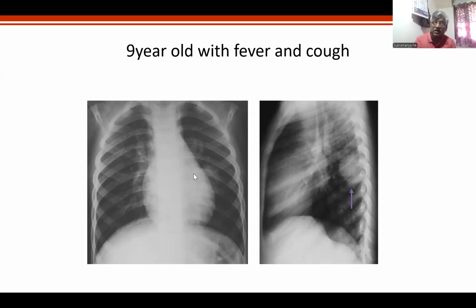How was it missed? Now we come back here. Actually, there is pneumonia here. It is so subtle and it gets missed. You understand my point? And my problem is, sir, is this also pneumonia? Don't keep on asking me like this, sir. Can this be pneumonia? For all this, you need to become familiar with the anatomy. This is what I was talking to you about, becoming familiar with the anatomy. Don't get scared. It is not very difficult. It is easy to master.